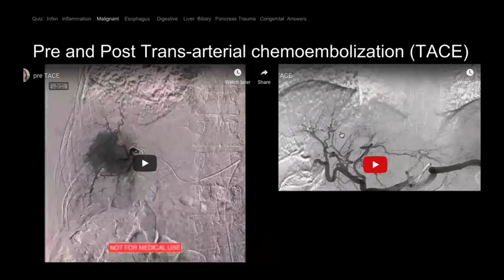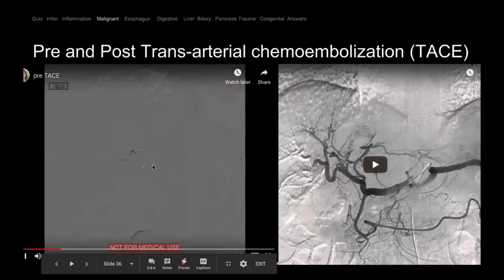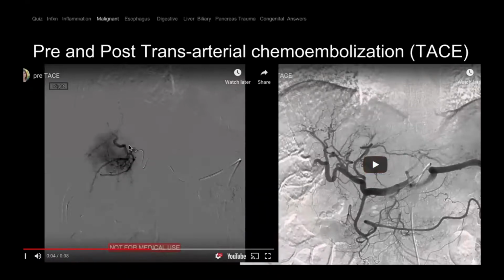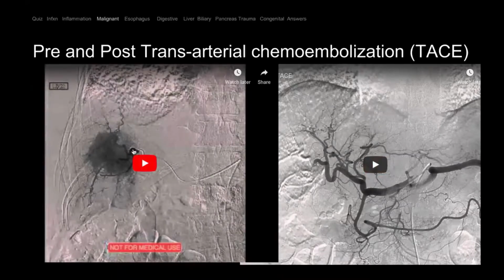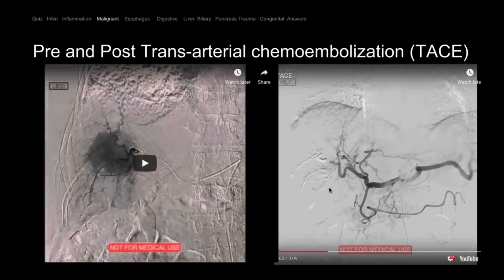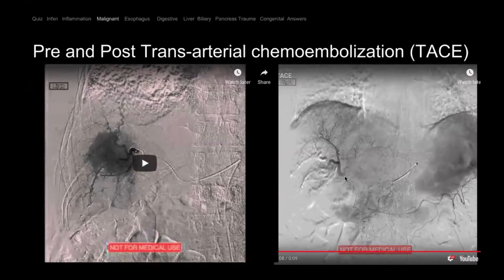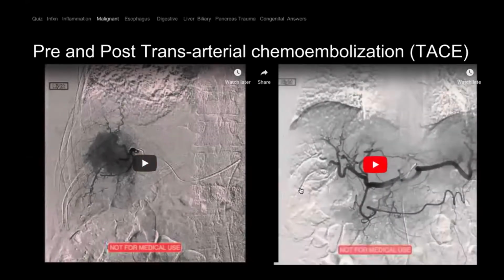And the way to treat HCC, depending on the size, the definitive treatment is liver transplant, but organ allocation is limited because we don't have sufficient organs to meet everyone who needs it. So there's TACE, transarterial chemoembolization. HCC, we said, is very vascular. So you can see this parasitic vessel here that is supplying this mass. You can block that artery with little beads, and that's what we see here. You block the supply and kill the tumor. So this is called transarterial chemoembolization, TACE.